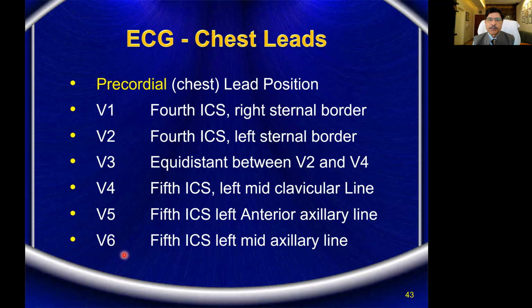Now, how many lateral cameras do we have? If something is happening on the lateral surface of the heart, or the left side of the heart, we know it in L1, in AVL, and also in V5, V6. If something is happening in the septum area, we get it in V1, V2. In the anterior surface of the heart, V3 and V4. If something is happening on the diaphragmatic or inferior surface of the heart, we will see it in L2, L3 and AVF. These are the inferior cameras.